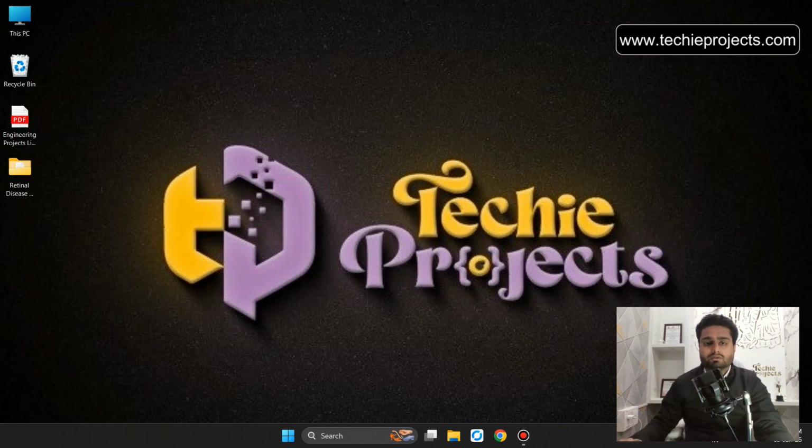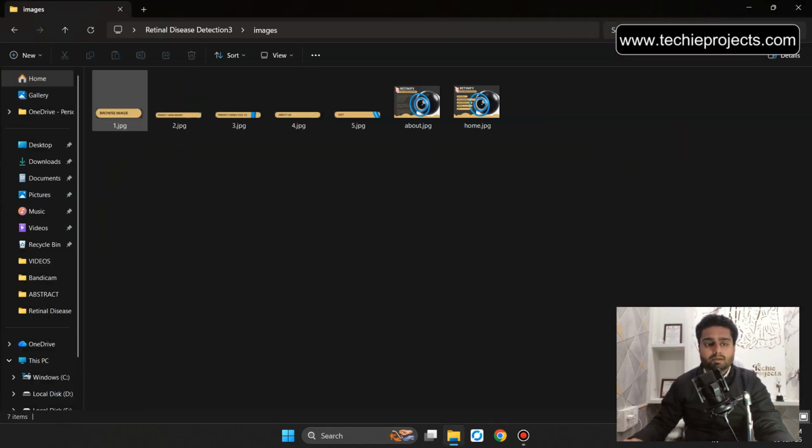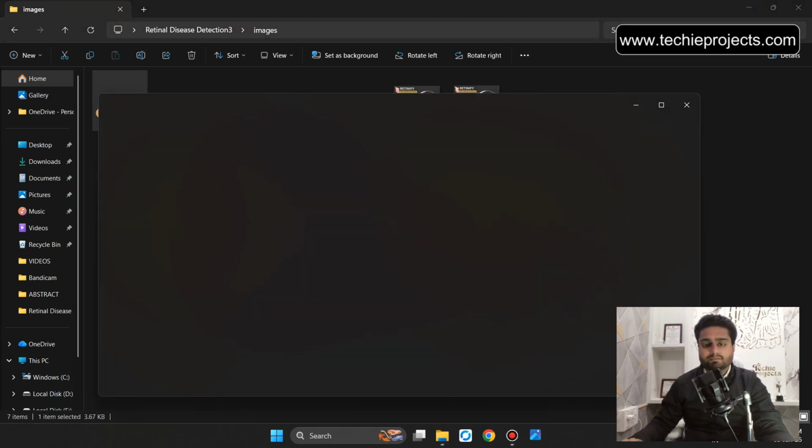So in this video I will show you the retinal disease detection using machine learning. So let's open the project folder. This will be the project folder and those are input images. Let's open one by one.